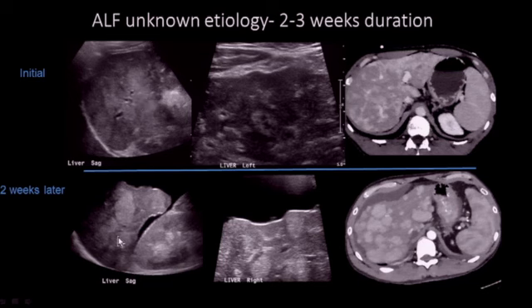By 2 weeks later, the echogenic areas are now much more discrete, rounded, and lobulated, alternating with hypoechoic areas. The liver has shrunk even more, and the contour is extremely nodular, well visualized because of all of the ascites around it. On CT, again, you can see the higher density nodules correspond to the hyperechogenic nodules on ultrasound, with alternating low density areas and ascites.